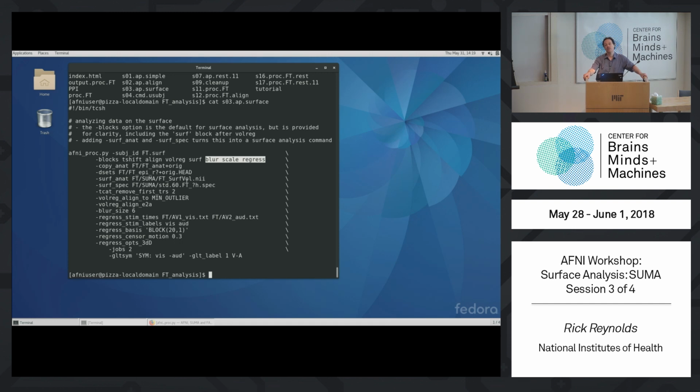But when you map from a volume to a surface, can you choose the thickness? Well, if your 4 millimeter segment between node 1017 on the inner surface and 1017 on the outer surface intersects, and maybe you've stretched it or shrunken it a little bit, or shifted it, you can do all this stuff.